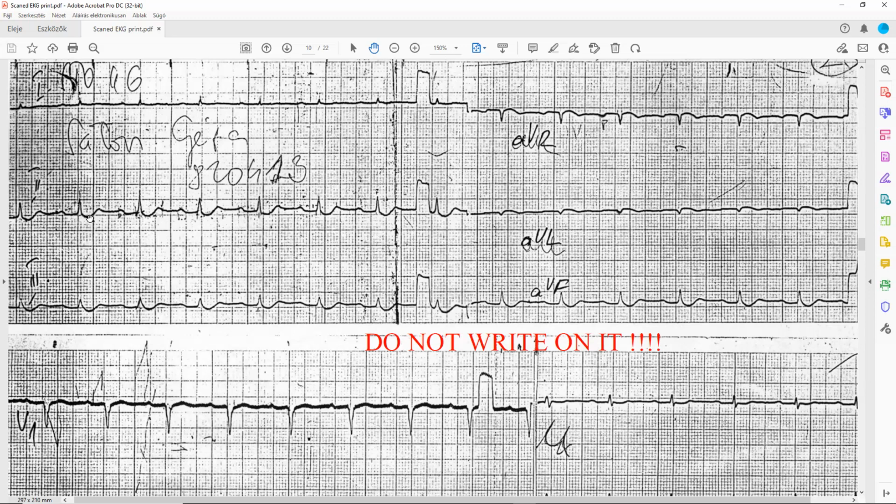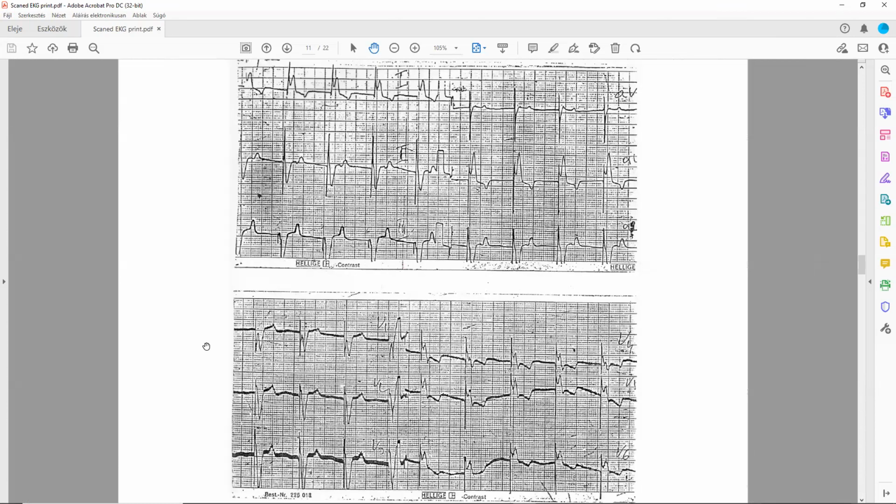You should watch the ions and everything and the ST segment. That's a digitalis effect. It can be a digitalis effect, okay? That is going to alter the ST segment, something like this. Now we finished, okay. Oh yeah, that's a good one.